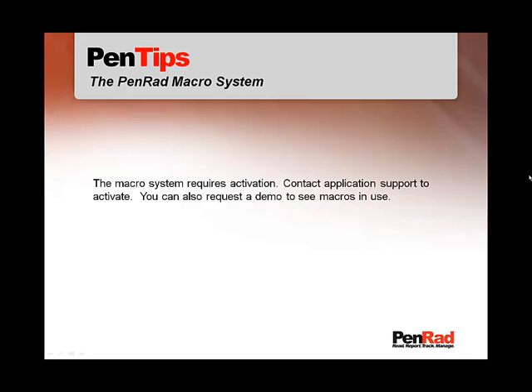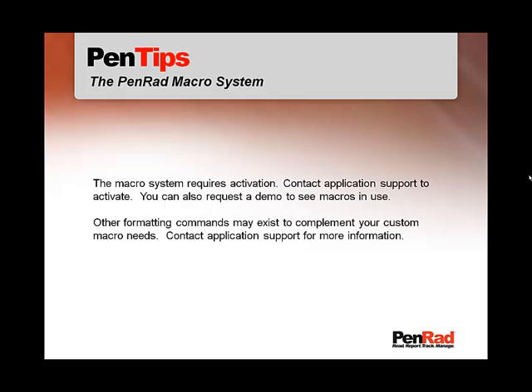The macro system requires activation. Contact application support to activate or request a demo to see macros in use. Other formatting commands may exist to complement your custom macro needs. Contact application support for more information.